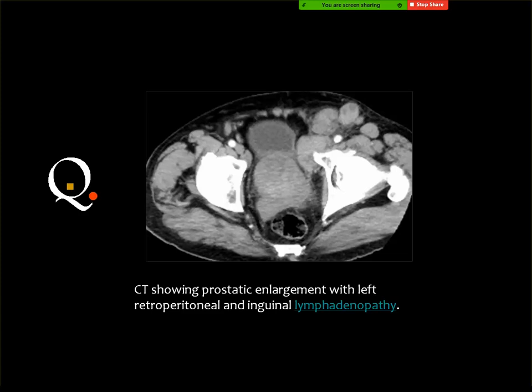You know that inflammatory nodes are not solid like this. They should contain some central areas of breakdown, and the periprostatic fat should be stranded, and also the fat around the lymph nodes. Then prostatitis is not in the differential diagnosis.